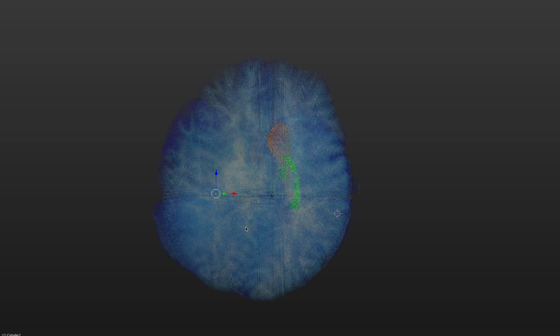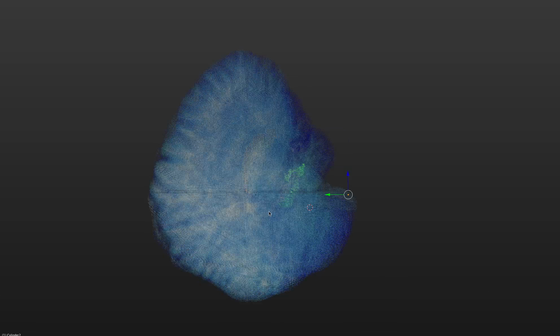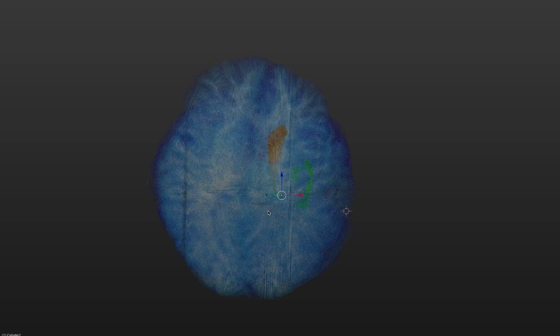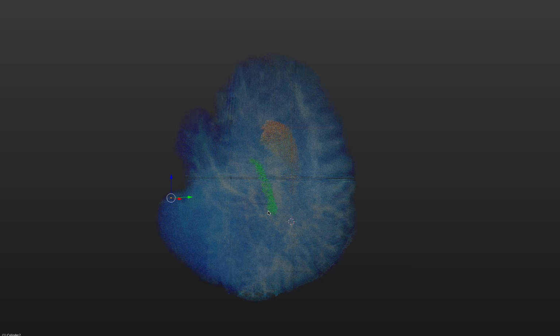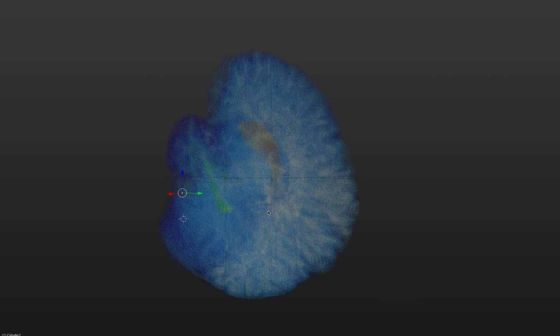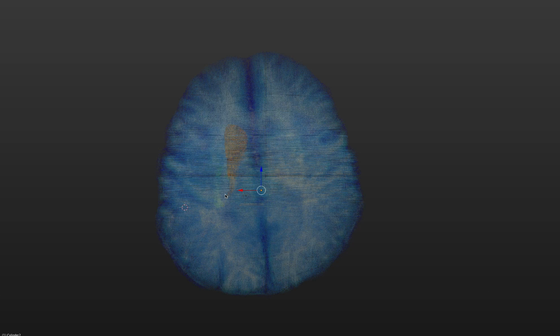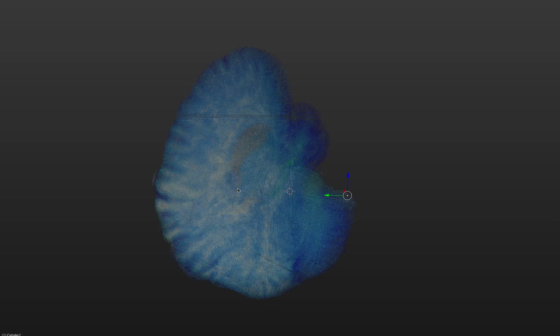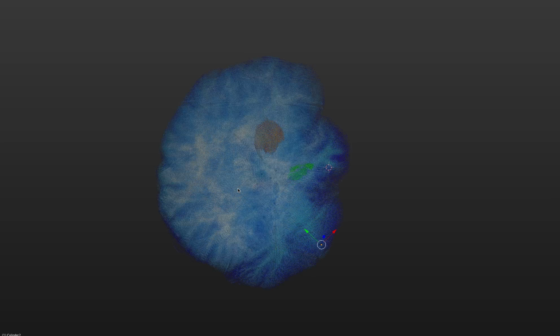In this case, we have the hippocampus plotted and the caudate. These are just areas of the brain, but you could do this with the whole brain, whatever area. And the cool thing is that you could also put these inside each other. They could be plotted orthogonal to each other so that you could see all of them at the same time. And so this is how this could be very useful for a clinician.